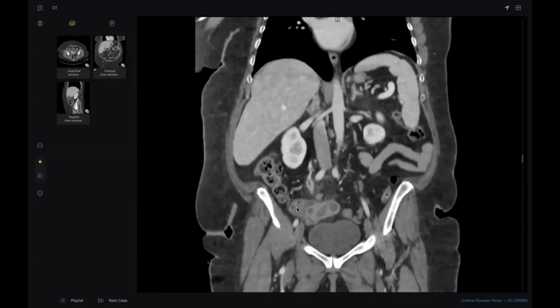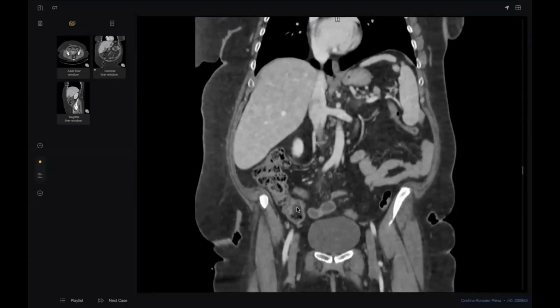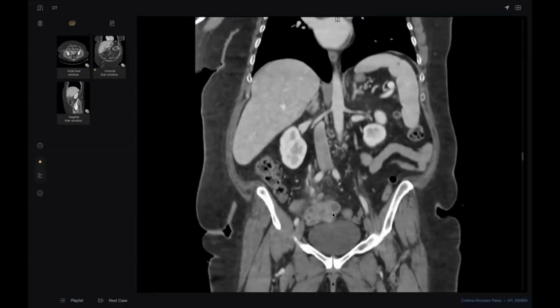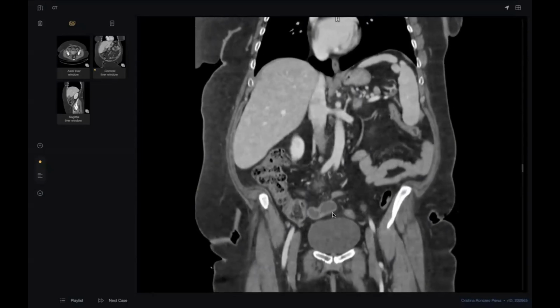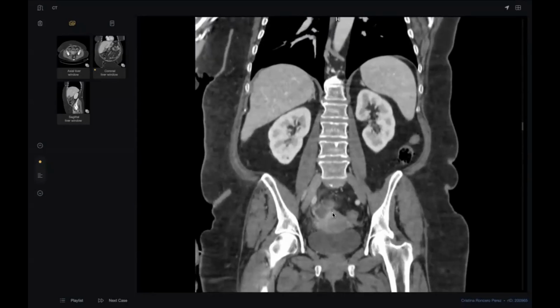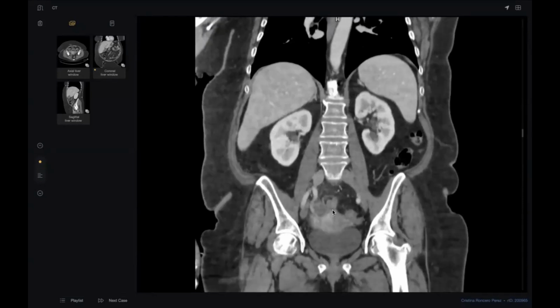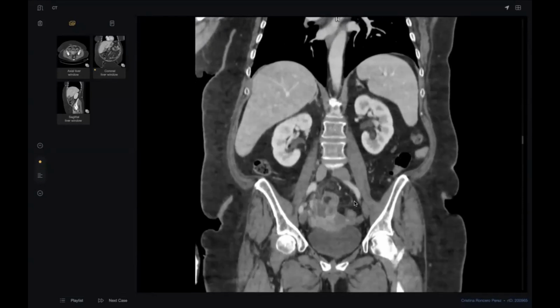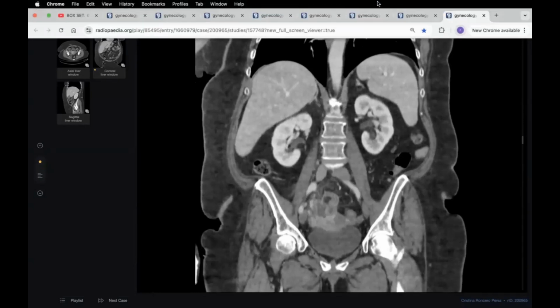That means, sorry, I indicated wrongly. This is the tubo-ovarian abscess, my colleague, sorry. Okay. And where is the dilated one? This one, this is the hydrosalpinx. What happened first? The tubo-ovarian abscess, and then it caused a reactive appendicitis.